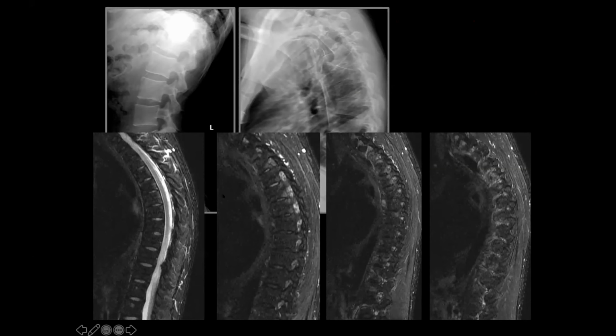And if you look on these sagittal images, you can see faint but obvious corner edema of the posterior vertebral bodies. And this also involves here multiple pedicles and the expected location of the costotransverse joints. This is to say that posterior element edema can be isolated in these cases, and it's very important, especially when we don't have axial T2 FATSAT, to look very carefully at the sagittal STIR.